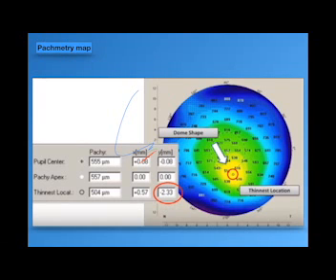Also, we have to study the figures in both eyes to correlate the thickness of the cornea, the thinnest location in the right and left eyes. And the difference should be within a limit of 15 micrometer in some textbooks, and maybe less than 10 micrometer, between the thinnest location in one eye and the other.